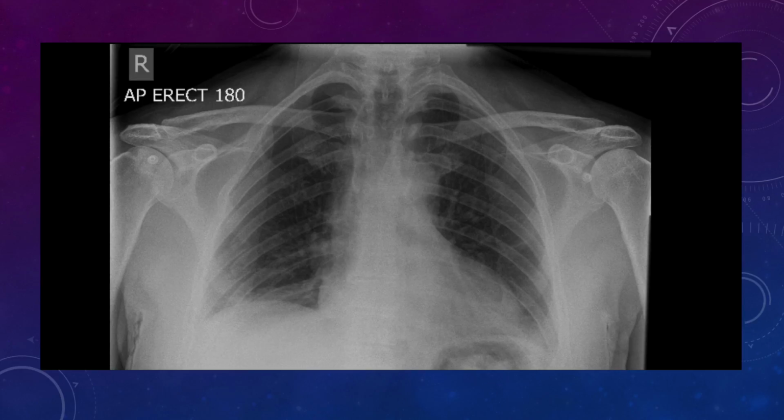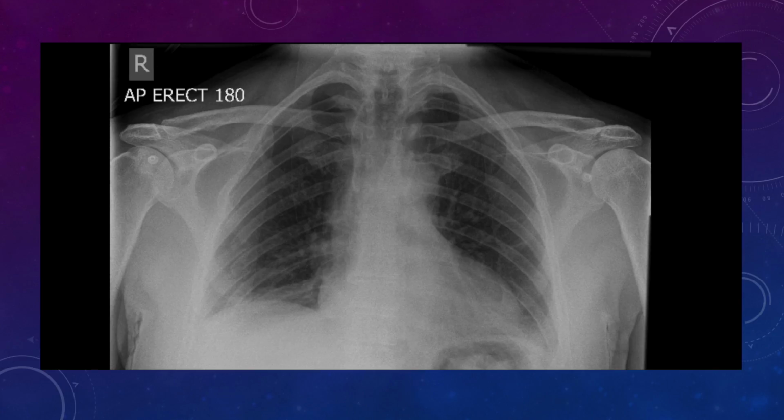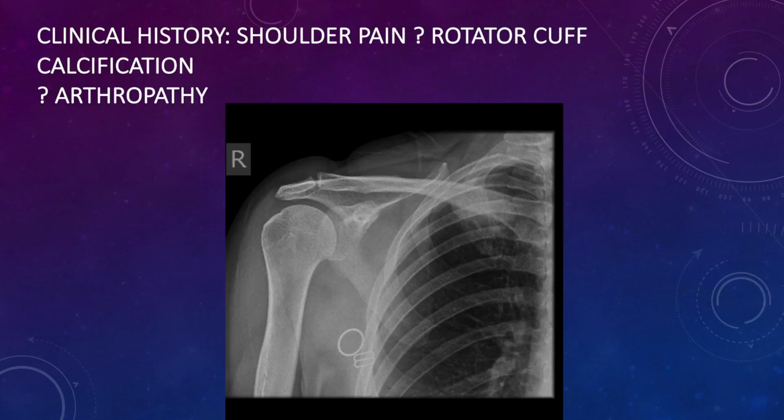And the periphery of the image, it's classic with an MSK film as well. Whatever information the radiographers present you with, use that. Read it all, look at it all, not just centralising here. Make sure with your search strategy, you do cover all of the film, all of the soft tissues. They can be important and give you tiny clues to what's going on.